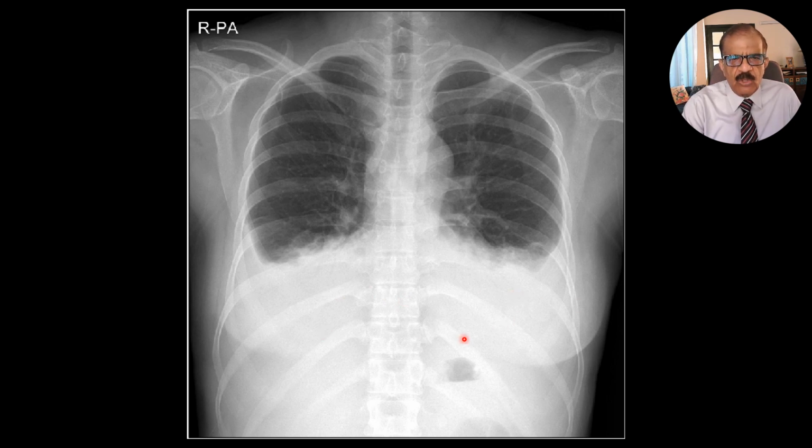And there's something else also. Let me see if you can figure it out. Well, this X-ray is basically here for pleural effusion, but there is an observation. See this part, there's some soft tissue opacity here. If you see this part, this is the line. I'm not sure if you can also see, because I am seeing it on a bigger computer screen. You are probably watching it on a small device, but there is an opacity here. So I think that is to be noted. Could be common etiology: tuberculosis, malignancy, lymphoma, or something like that.